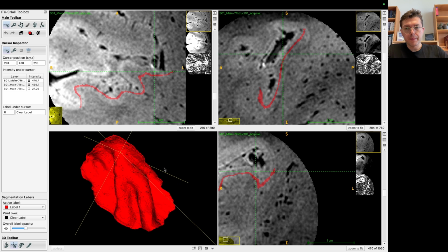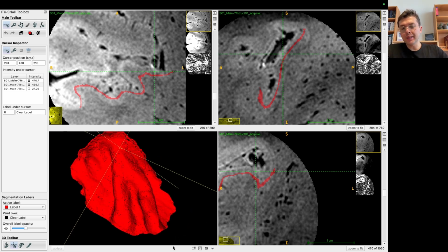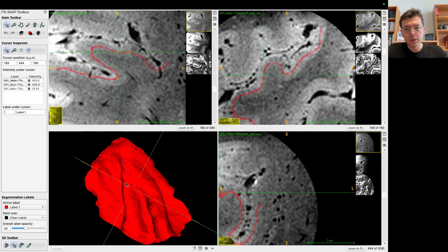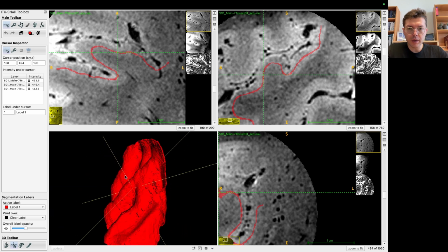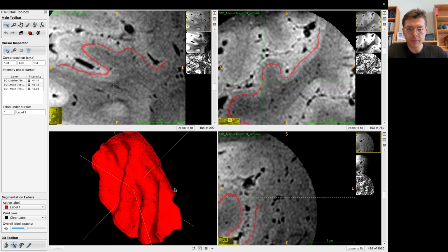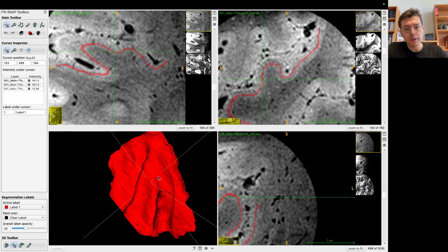And now we might end up segmenting a little bit larger than this, but I think for this video it is good enough. And we can easily extend in the future, not a problem. So now I'm going to locate an area that is more or less at the middle of this Heschl's gyrus. And I'm imagining a disk that would wrap around here, like a pole there, basically, and take the shape of the local geometry. For instance, this is a good spot.